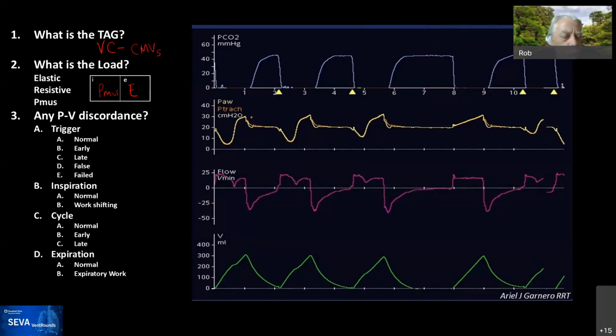Again, inspiration is work shifting, cycle. These are mandatory breaths. I don't see any indication of abnormal cycling. Expiration is normal.